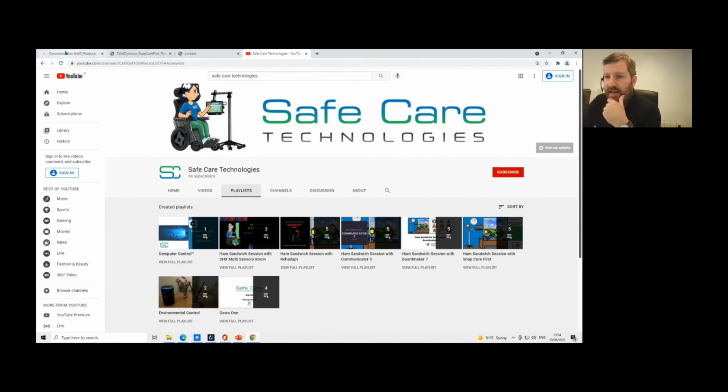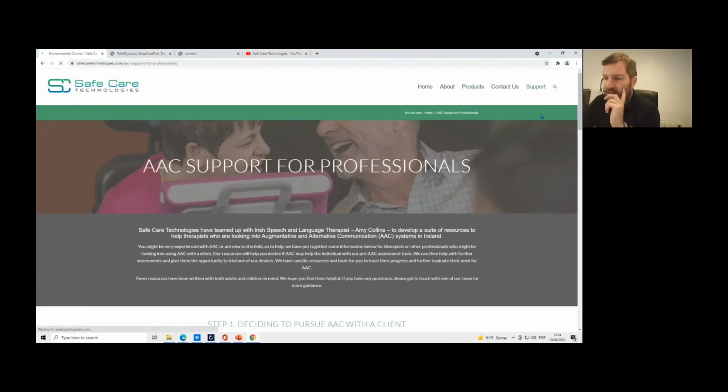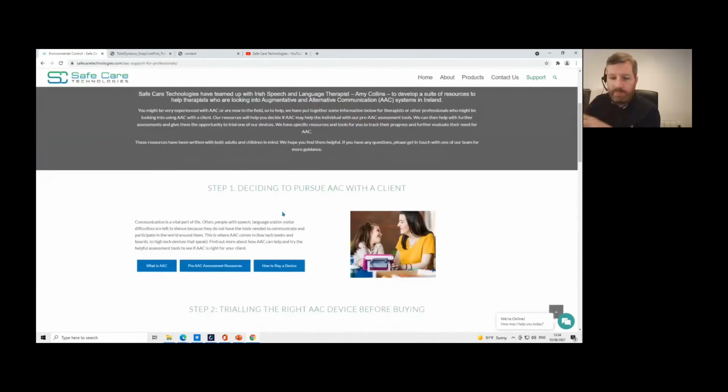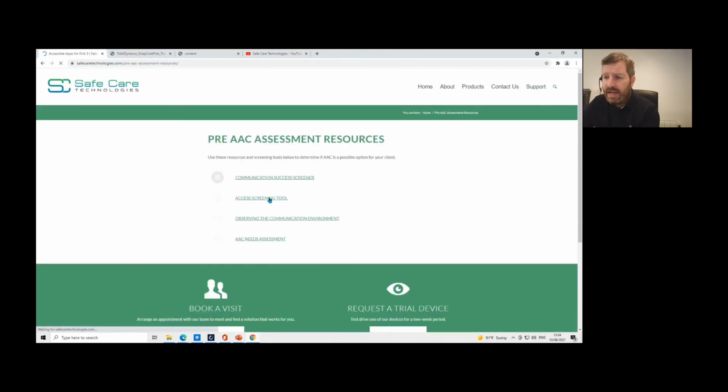And the last thing I'll show you on our website, if you go to support, you can see AAC support for professionals. So this isn't strictly for TD Snap, but it's just for if you're a therapist and you're new to AAC and you're new to using communication software, we've set up these resources to help you along. So it's set in different steps. So deciding to pursue AAC with a client, what is AAC? We have pre-AAC assessment resources. So if you're bringing somebody in for an assessment, we've got some of these screening tools, a needs assessment. So again, you can get all these for free on our website.